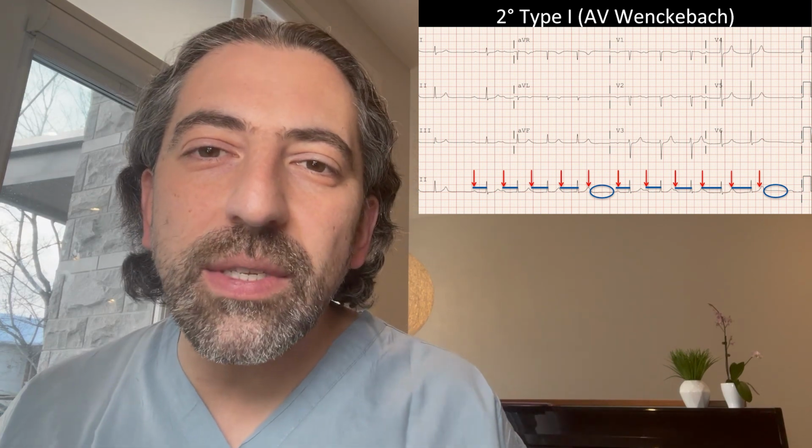One important thing to also recognize, sometimes it's hard to see the PR interval prolonging if you compare subsequent beats. So if you look at one beat and then you look at the beat after it and the beat after it, and you're just comparing those two next to each other, it's hard to see the subtle changes in PR interval. It may be prolonging a little bit, but it's hard to measure.